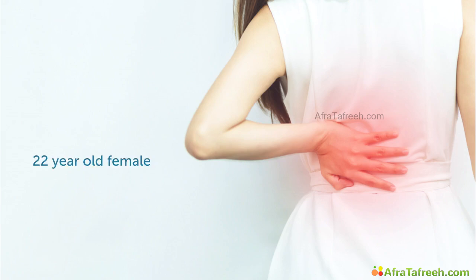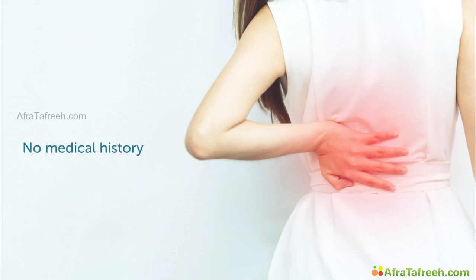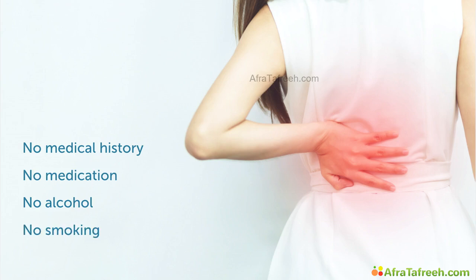Dirk showed you a lot about normal findings and standard views, even a pathology. Let me show you some more clinical cases out of my daily practice. A 22-year-old female enters the office. She complains of massive back pain and high fever and nausea. She has no medical history, she takes no medication, she's not drinking, and she's a non-smoker.